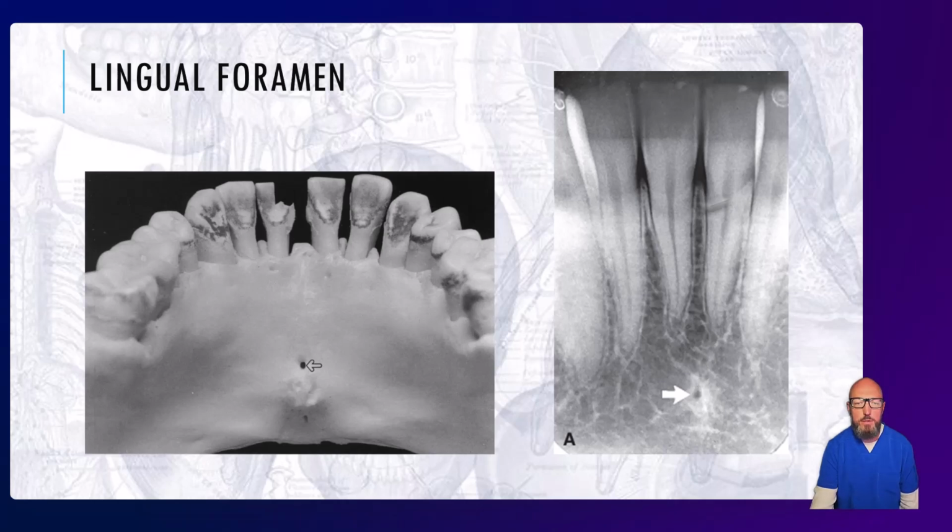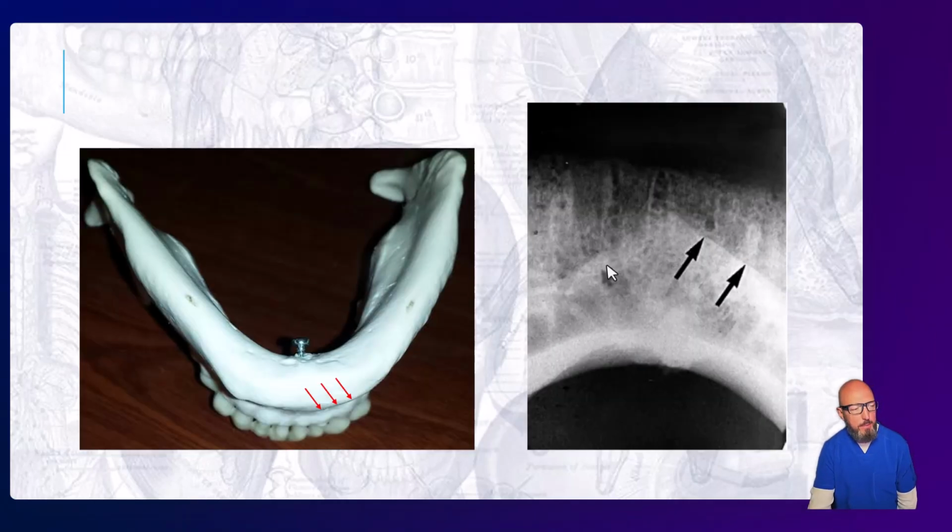You may see several. If you've never seen this before, it might be confusing, but if we get a steep enough image, you can see how that ridge of bone on the mentum, on the chin, can project over the intraoral radiograph. It is a bony structure, and that's just the mental ridge.